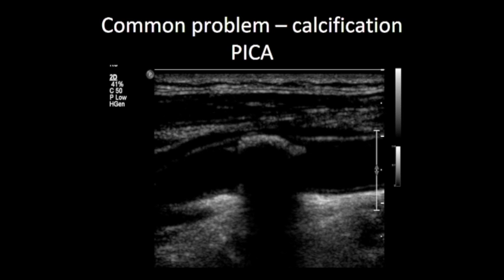Crunchy. This is an important case because it's something that we face every day. I was at a session of a vascular meeting, and a guy presented a paper from a very famous institution in Boston, not the Brigham and Women's Hospital, where he said that carotids were not very accurate in the presence of calcifications. And so he said, worthless, okay? And calcifications do represent a problem because you can't see underneath the calcifications, okay? And I totally agree with that.